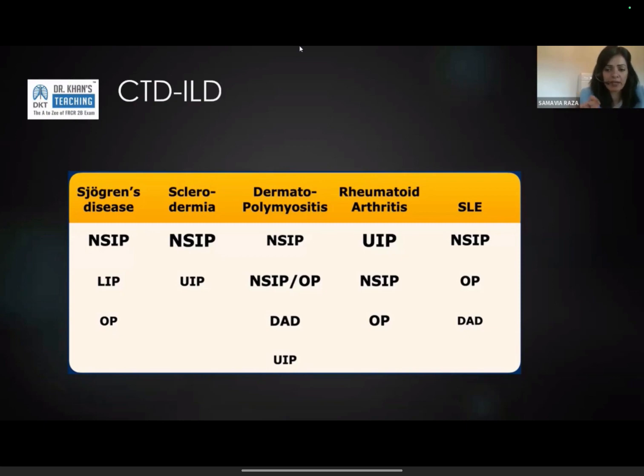Can OP be diagnosed on the first scan, or do we need a follow-up scan? You can diagnose it on the first scan when it's OP and it's clearly OP. It's very nice to look at, and when you've seen it, if you're confident, go ahead and call it. Like I said, you're describing the lung appearance. You're not really calling it COP. I think your question is, can COP be diagnosed on the first scan? So the COP cannot be diagnosed on the first scan. Organizing pneumonia can be. Whether that organizing pneumonia is cryptogenic organizing pneumonia, or COVID, or nitrofurantoin lung or chemotherapy-induced lung, you can't.